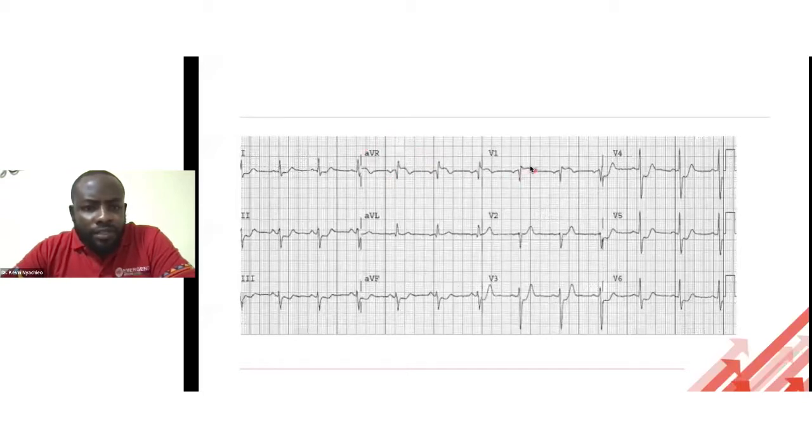You're also noticing there's another ST elevation here, though more or less the same in V1, okay. But significantly, at first look, you will notice there's widespread ST depressions, okay. V3, V4, V5, V6, okay. Lead 1, lead 2, lead 3, aVF, there's significant ST depressions. At first look, when you look at this ECG, even before you notice this aVR, you have to notice these significant depressions all through most of the limb leads. These depressions, most of the precordial leads again, these ST depressions.